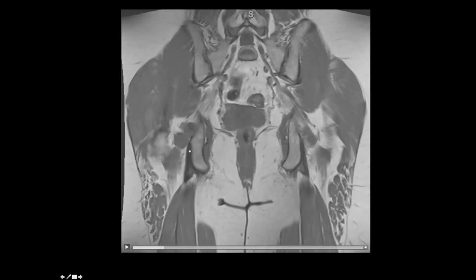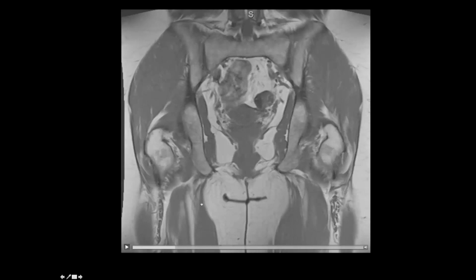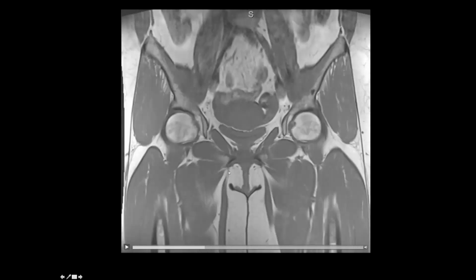We see first the semimembranosus tendon, which attaches more superiorly or proximally and laterally on the ischial tuberosity. And then we see the biceps femoris and semitendinosus. Now, the semimembranosus and semitendinosus will travel medially, while the long head of the biceps femoris will travel laterally. If we continue more medially, we see the adductor magnus, and then most medially we will catch the gracilis.